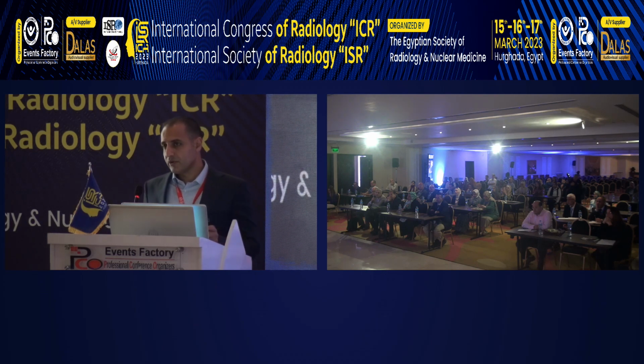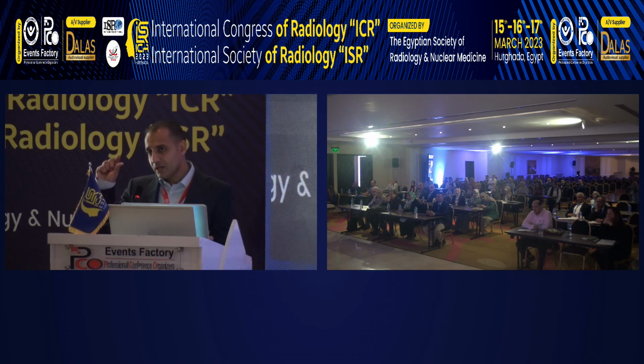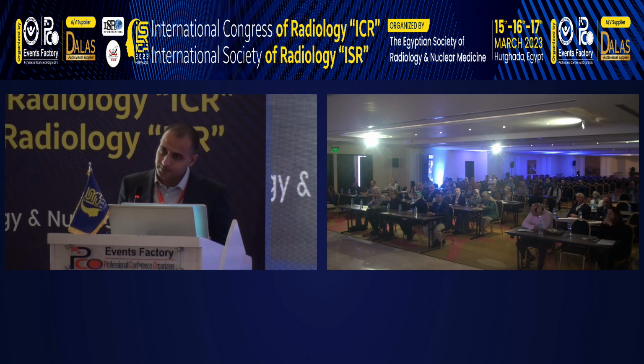Yes, this is right. The most uptake will be in the first, second and third stages. In the fourth stage, we can see fibrosis, low signal at the axillary recess, and sometimes adhesions, as I mentioned. The axillary recess will be obliterated, and in one case I saw it tethered to the bone. If you ask the patient, he will describe the classical symptoms of adhesive capsulitis even if you don't have intense enhancement like in stage 4. Yes, we depend upon the clinical scenario and the signs you mentioned.